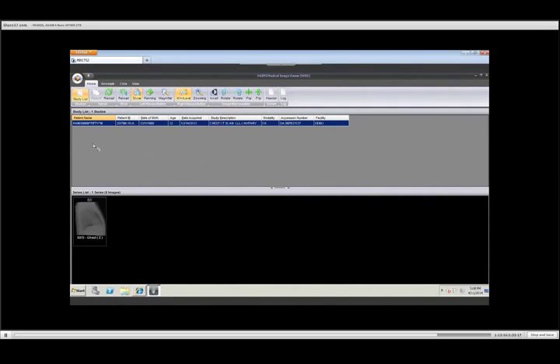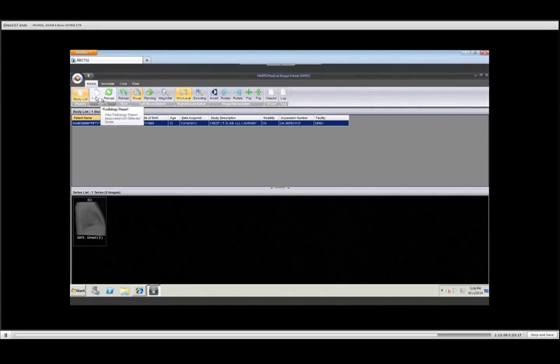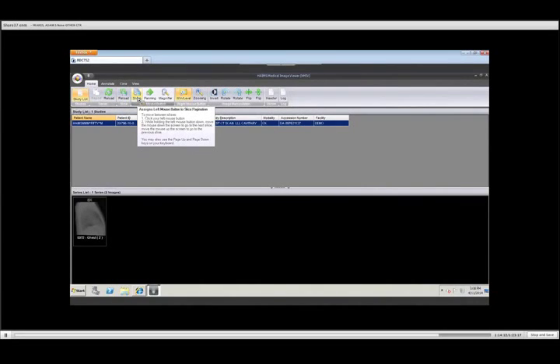Up here under the Home tab, I've got Study List. I've got the report. If there was a report for these images, it would be here. I've got my Reload series. You notice as I'm hovering over these icons, it's telling me how to perform the function. And we'll come back to that in just a moment.